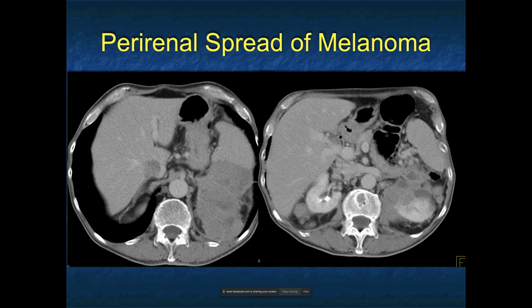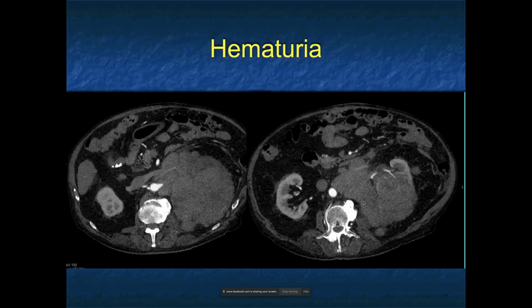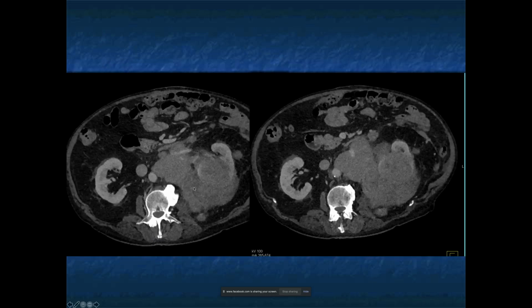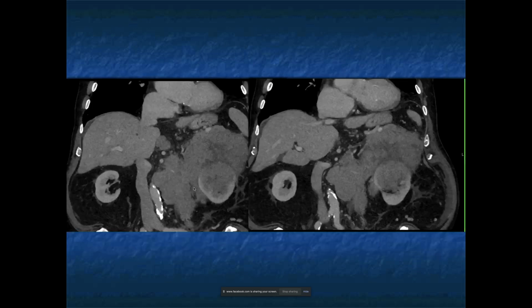It's interesting to me when you see lymphoma, particularly when it's extensive, you almost have to say, if it wasn't lymphoma, think about melanoma. And another case looks like a large renal mass, but so much of it is in the para and perirenal space, pushing on the aorta. It could be a large renal mass like a renal cell, but just the involvement of the perirenal tissue takes you away from just a classic renal cell, be it papillary or more likely clear cell, and pushes you more to something like lymphoma. Lymphoma can be bilateral, but it can be unilateral.